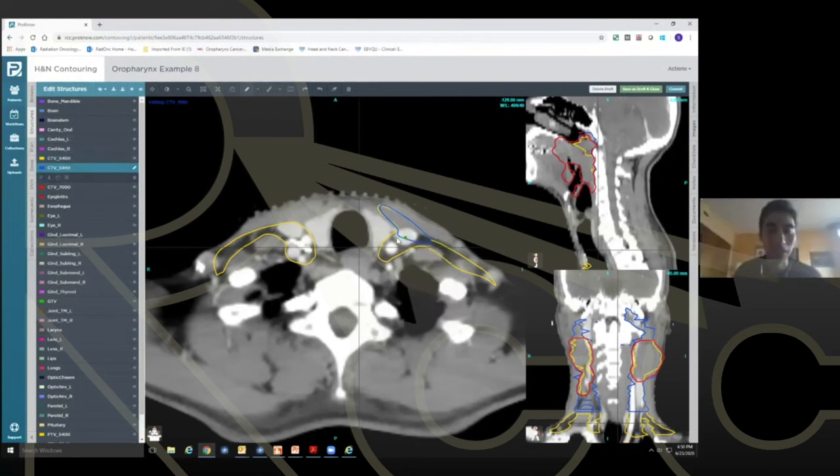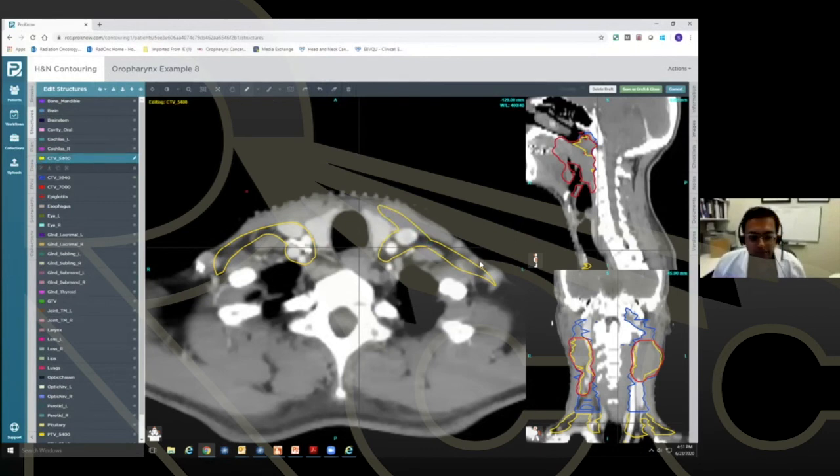There's a little eraser at the top. Oh. Yeah, you can see I'm not very good at this. I'm used to using Eclipse, so I'm trying to use Eclipse. This is great. You can just click escape to exit, and then there's a little eraser. I see. Right here. Yep. This one? Yep. Okay. There we go. All right.